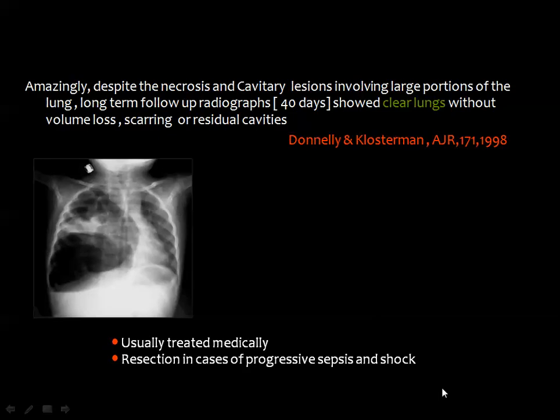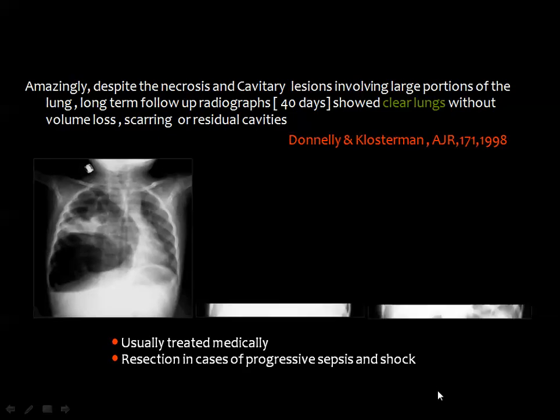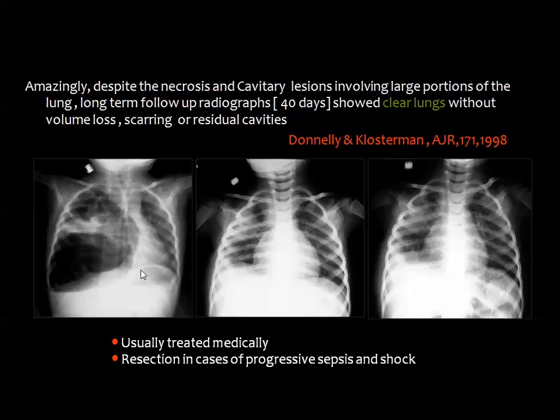Then the follow-up chest X-rays of the same case showed that there is considerable regression of the pathology in the right lung, and this last X-ray showed almost total resolution with regain of the normal appearance of the right lung in spite of the presence of some pleural collection.